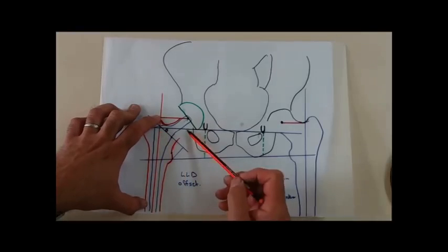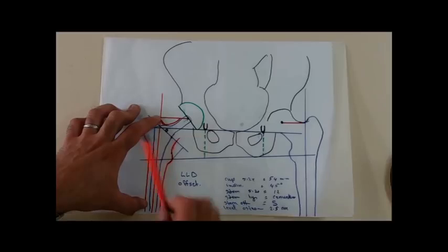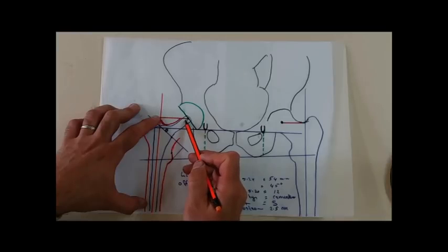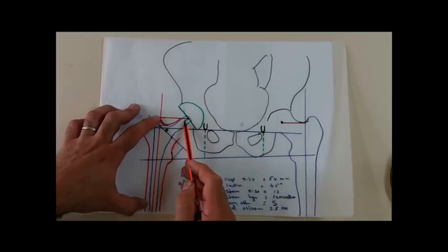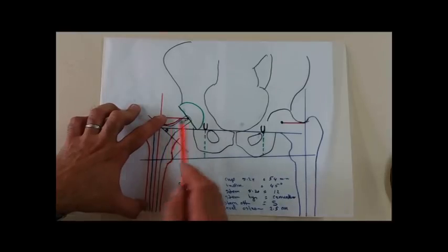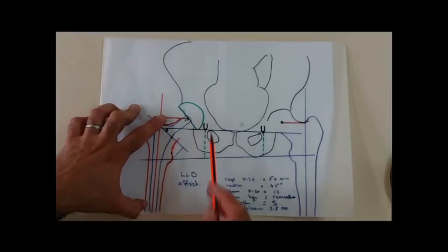But what to do if I am dealing with a cementless stem? In the cementless system, I cannot play with the position of the stem. In this way, I can solve the problem of increasing the offset by choosing less neck length. For example, if from the start I chose the medium, I will choose the small neck length. By choosing a smaller neck, I will decrease and solve the problem of the medial offset increment. But choosing a smaller length will also affect the hip length.